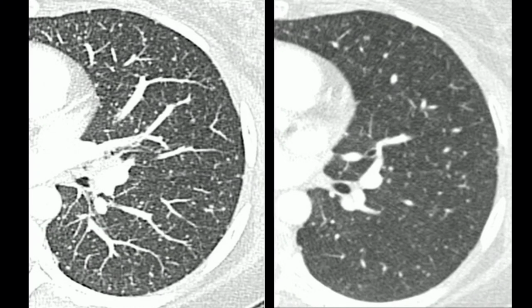The image on the left is a MIP. Note the nodules on the pleural surface and also diffusely throughout the parenchyma. This is a good example of how these disease processes are in a continuum. This looks like centrilobular in some areas, but I suggest you focus on what the predominant distribution is, which in this case is random. There are nodules in the parenchyma, along the fissures, and in the subpleural lung.